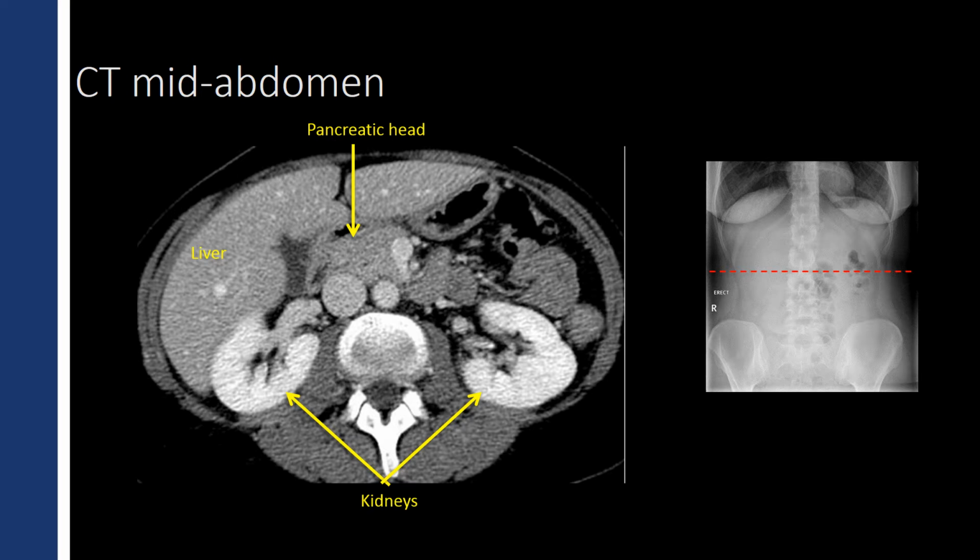Posteriorly and very medially are the kidneys. Again, the kidneys are very bright, and that's because they're concentrating that contrast in order to excrete it. Now we're through the crura. The crura has already blended with the posterior wall of the abdomen, and so we see the aorta is no longer retrocrural because there's not a crura to be retro or antero.